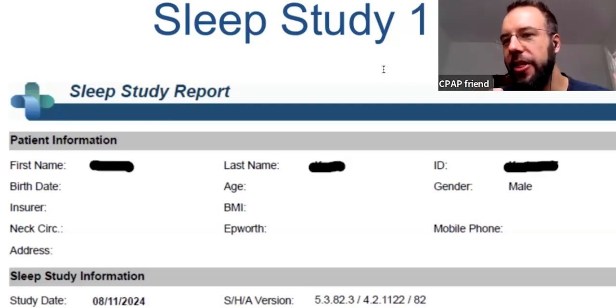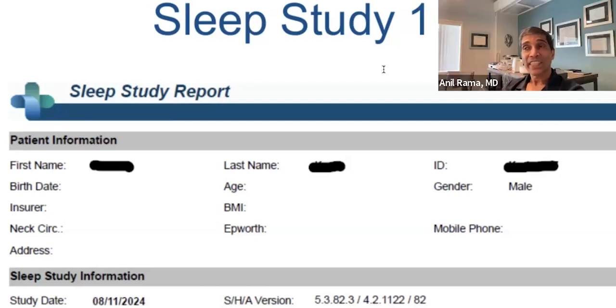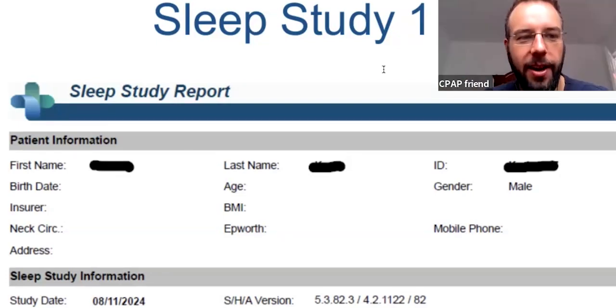Can a patient see in the report where, or even just if, a physician has overridden the report? The patient cannot see it, but on the CloudPAT software, there's a record. Everything is chronologically maintained that this was overread. Okay, that's all I think I have for this page.